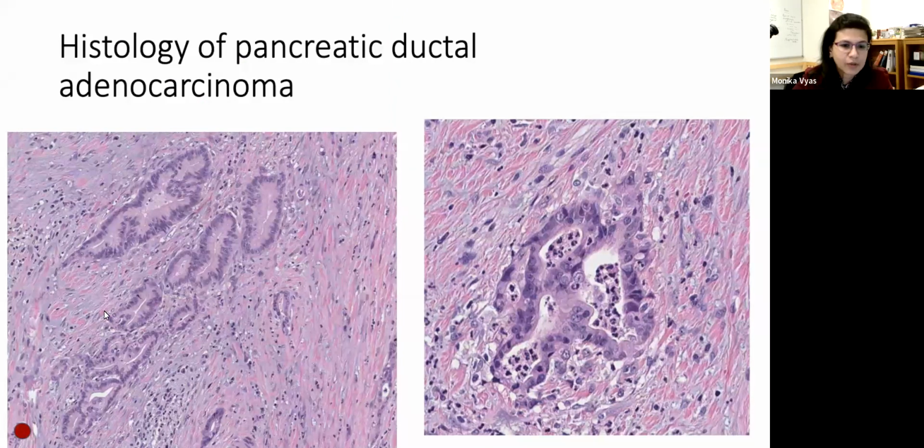So yeah, I'm pointing out the angulation here. You can see very angulated glands in this very desmoplastic stroma. This stromal response again is a clue and associates pretty well with infiltrative malignancies in the pancreas. You have this myxoid stroma with spindle cells, a very sparse inflammatory infiltrate, and then angulated, very bland looking glands. They don't follow the typical lobulated architecture that you would see in chronic pancreatitis. These would be very irregularly scattered about in the stroma, which would again be a clue that these are malignant infiltrating glands.